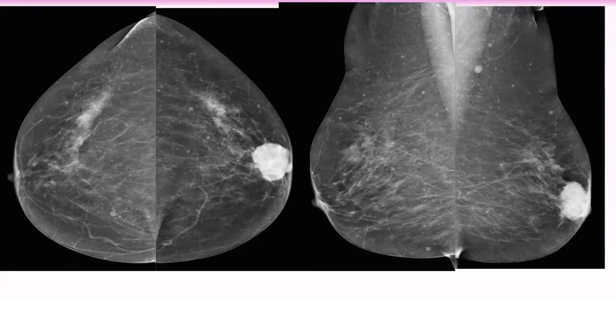Is this lesion on a background of ductectasia? I mean regarding the diffuse bilateral dense lesions in the breast, I mean these lesions on a background of ductectasia.